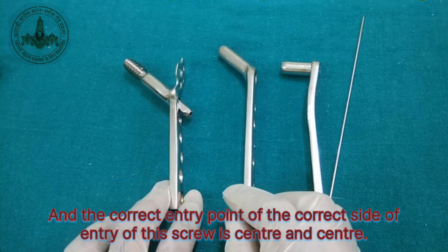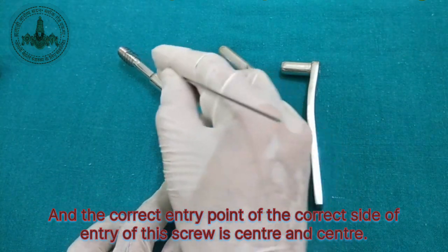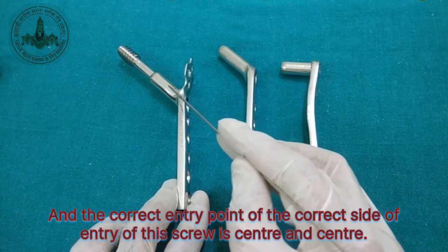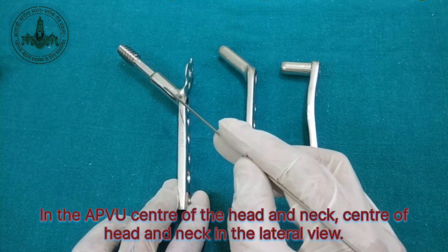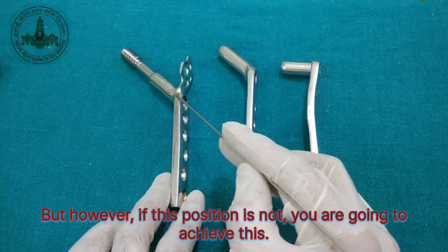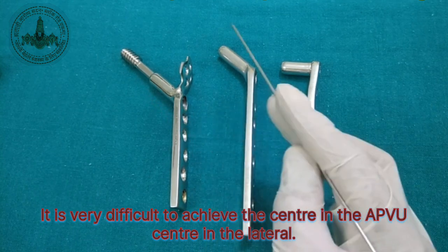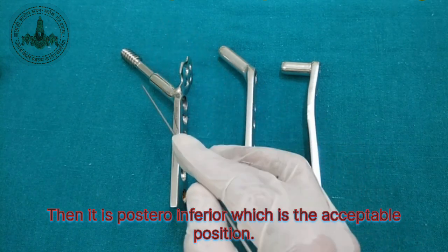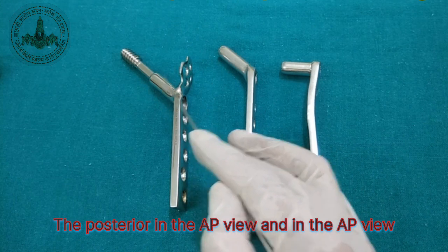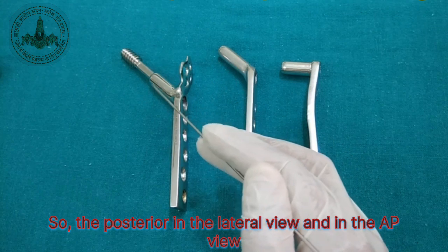And the correct site of entry of this screw is center and center. Center in the AP view, center of the head and neck, and center of head and neck in the lateral view. However, if you are not able to achieve this, it is very difficult to achieve center in the AP and center in the lateral, then posterior-inferior is the acceptable position: posterior in the lateral view and inferior in the AP view.